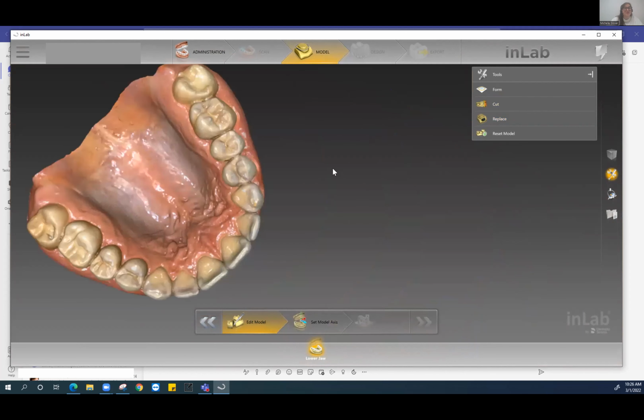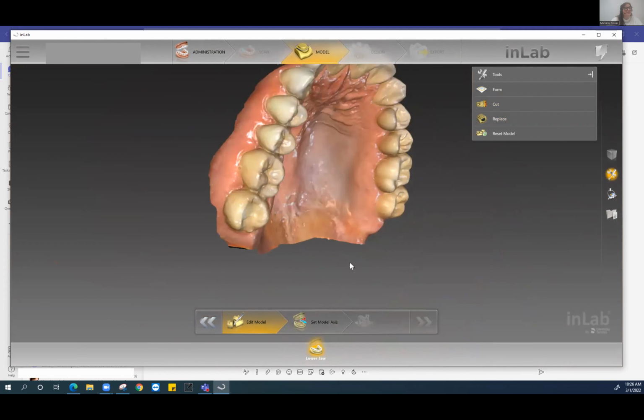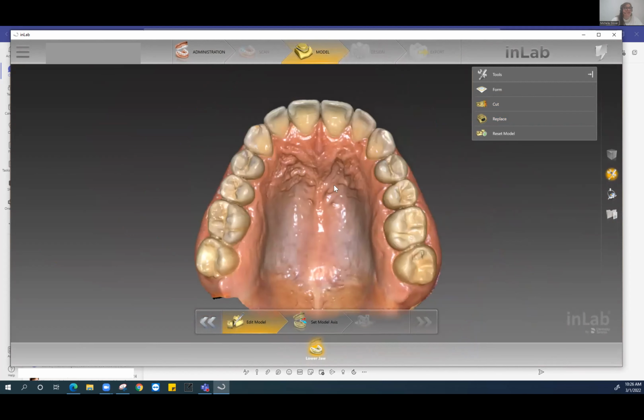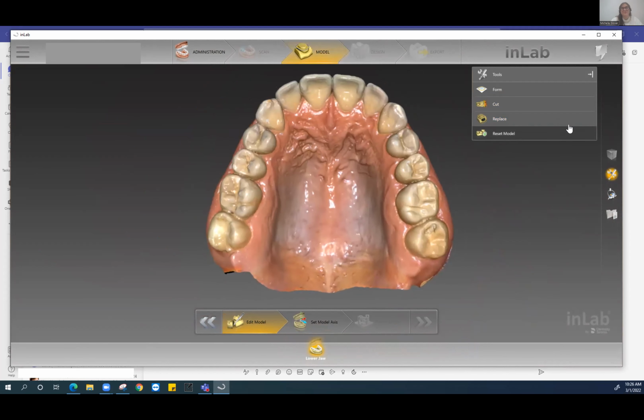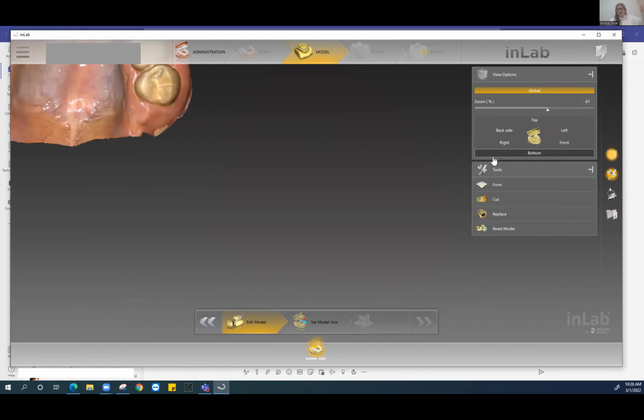Your right cursor allows you to physically move this. And then if you use your left cursor and hold it, it allows you to rotate it. And then you're able to, of course, move your model physically with this particular arch. Then we've got this box here that says view options. So there's global. So let's say you get a little bit out of scope, you can't find your model, you need to bring it back really quickly and you're struggling with the mouse.